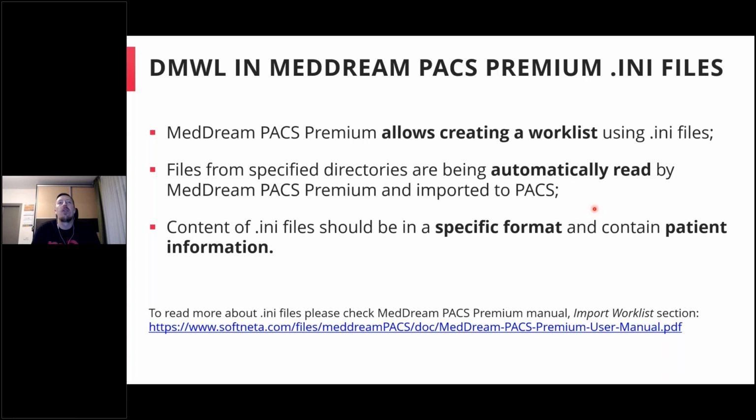Of course, the content of the ini file should be in a specific format, and it should contain the patient information. What this form looks like and what patient information you can add, you can always find in our PACS Premium manual in the Import Worklist section. Here you will find the whole list of the patient information fields which can be used.